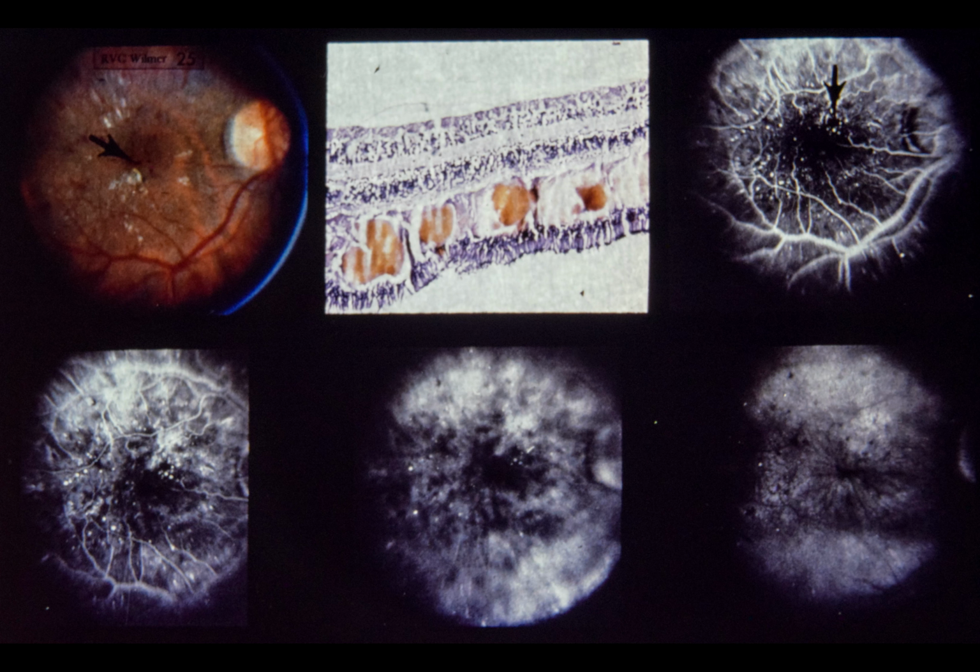Visual acuity was counting fingers before surgery and 20/40 2 months after surgery. Upper left, note hard exudates and dot hemorrhages in macula. Arrow points to hemorrhage in center of fovea. Upper center, in histologic section from another patient, note hard exudates in outer plexiform layer with VVG stain.